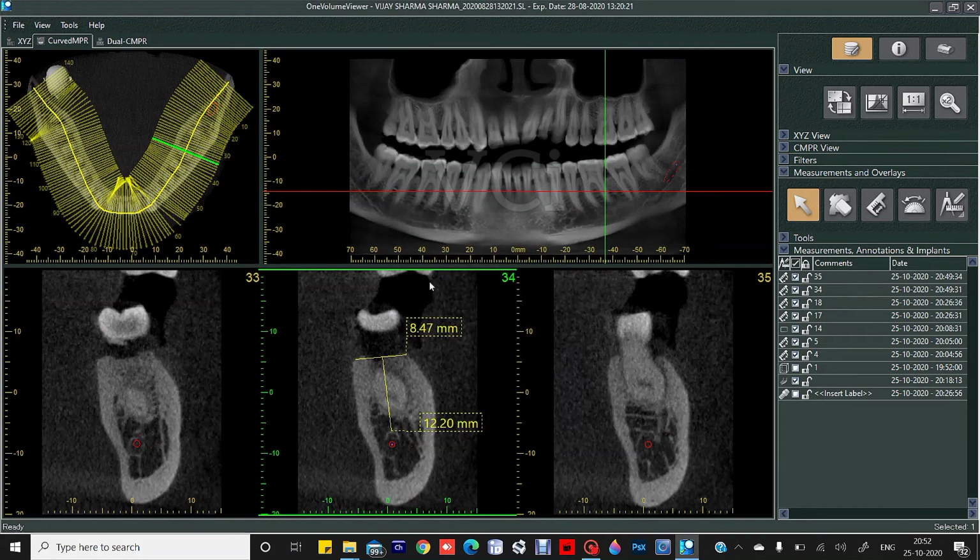And it is always recommended for the implantologist to study and check the bone or implant dimensions given above, and replan this implant study on the software that will be provided to you.